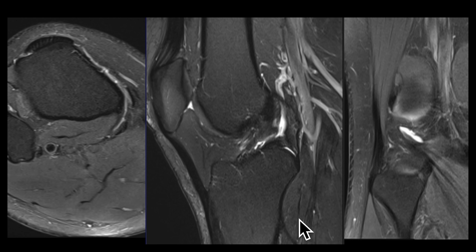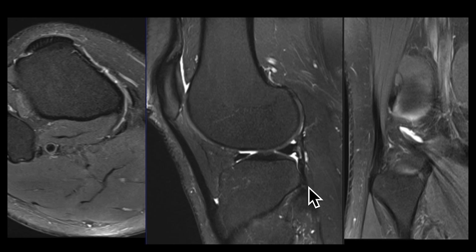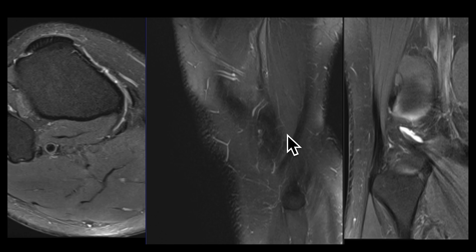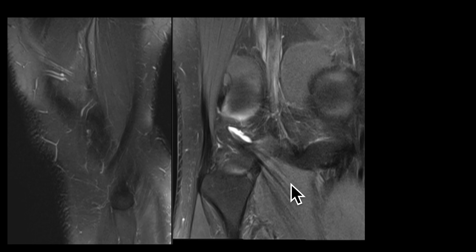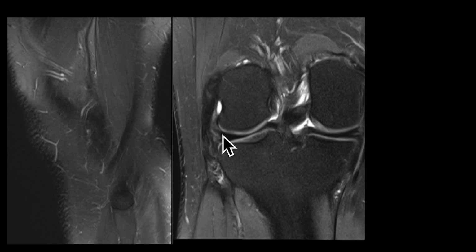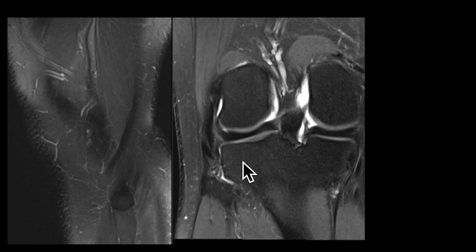So here's the muscle belly. This is the tendon centrally within it. As we follow this tendon, it's curving around the posterolateral aspect of the knee. This is a tendon again here, and it's going to attach onto the lateral femoral condyle. We don't see that attachment as well on the sagittal images, but we can certainly see it here on the coronal images. So here's the muscle belly. This structure here is a popliteal tendon, which is curving around the posterolateral aspect of the knee. This is still the tendon here, and then it's attaching onto the lateral femoral condyle.